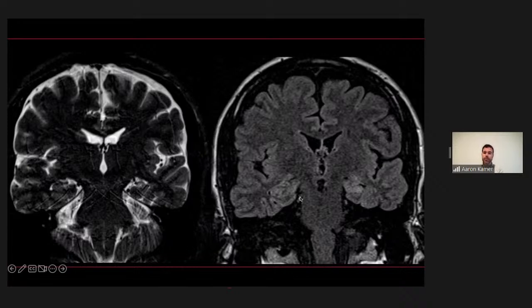This is a case of mesial temporal sclerosis, just run of the mill. Probably the seizures are coming from this patient's hippocampus. But remember, mesial temporal sclerosis does not show up in our earliest patients with seizures. This is something that tends to develop over a longer period of time. And this is a which-came-first, the chicken or the egg scenario.